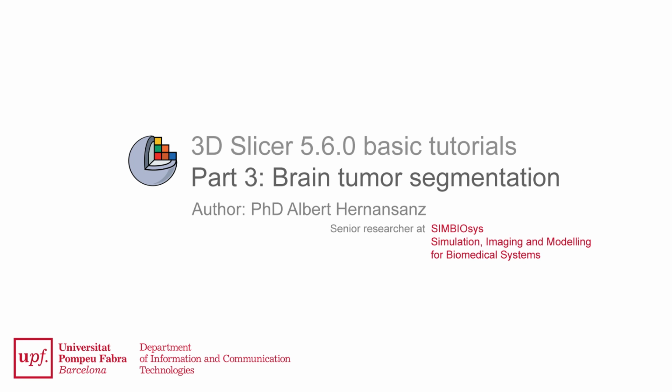Welcome to this 3D tutorial of 3D Slicer. This tutorial uses 3D Slicer version 5.6.0 stable release for Windows, but it is also valid for Linux or other operating systems. The MR Brain Tumour 1 sample data should be loaded.